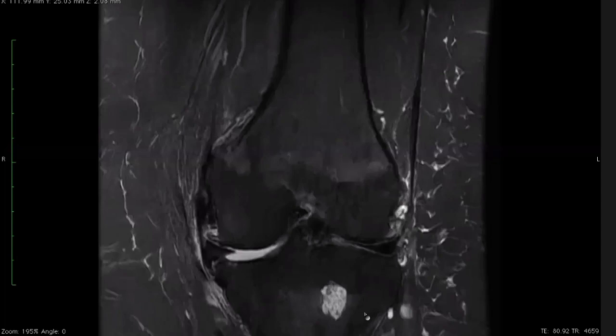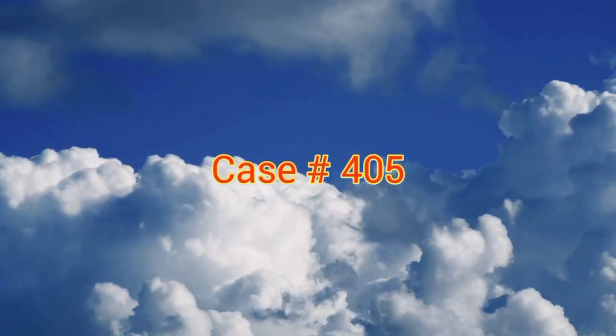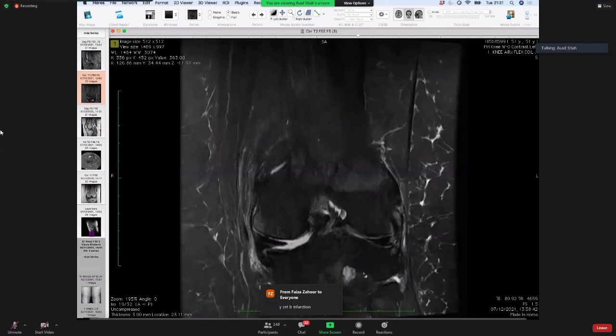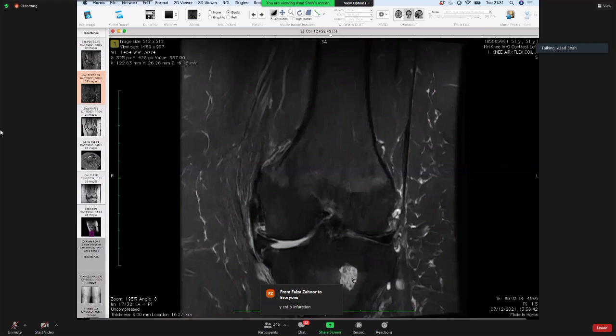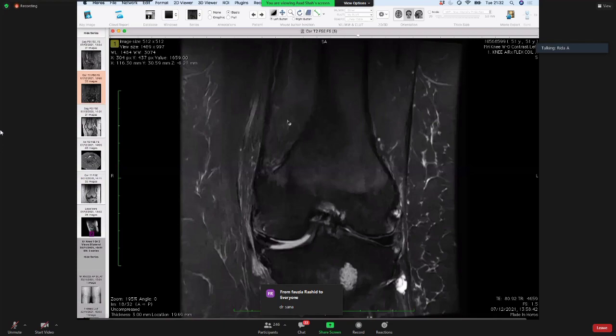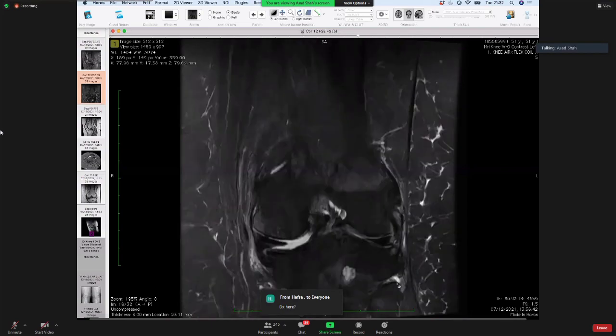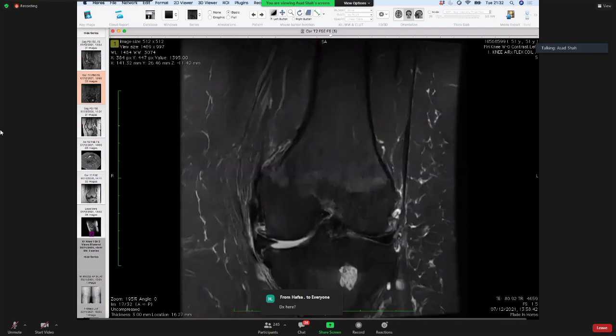This is just anything which is less than 5 centimeter without any edema around it. If it was next to the cortex, if there was any reactive cortical thickening, then you get worried about it. But this is a silent enchondroma, just a cartilage rest, you can say. It's just by the by. It hasn't got any relationship with these cartilage bodies that you're seeing here. They're two different things. It is an incidental finding only. And there's a small ganglion cyst arising from the proximal tibiofibular joint, which is again incidental. Any questions? No problem.